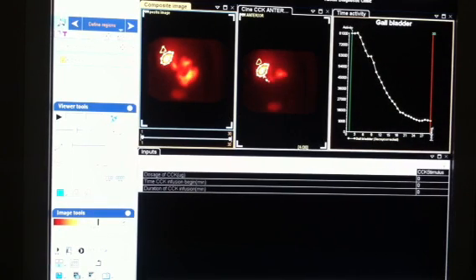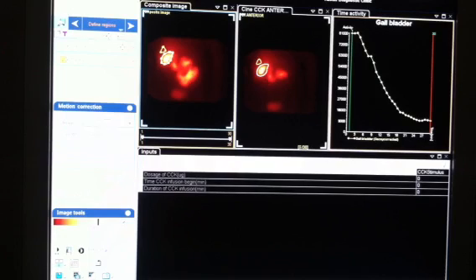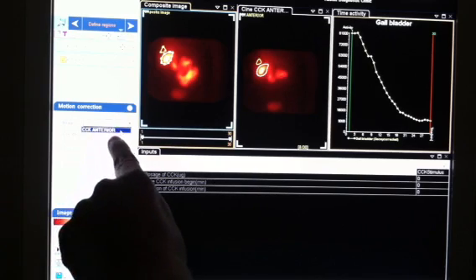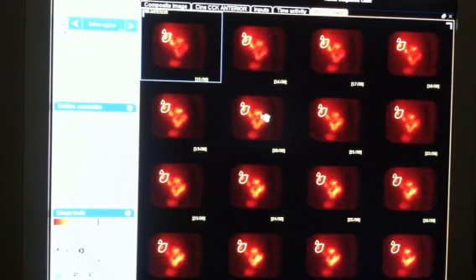And I'm going to look over here just to make sure that we don't need to adjust any motion. So in order to correct the motion here, we're going to come to Viewer Tools and Motion Correction. And then we're going to pick our file right here, which is CCK Anterior. We'll bring up this page here. It's going to bring each one of the cells. You can scroll through them with your mouse.